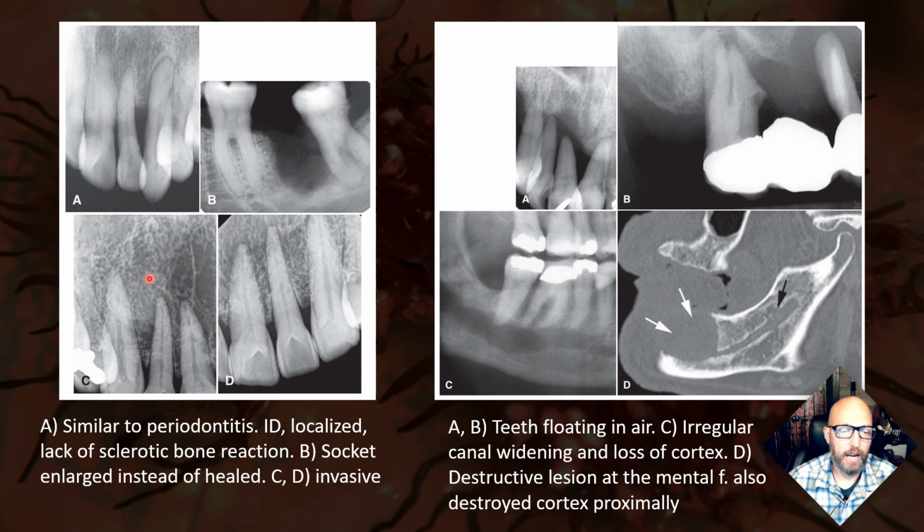It's starting to invade into marrow spaces, and then what's the key sign here around the roots of the teeth? See that little radiolucent haloing? We said malignancies really like to follow that path of least resistance. They extend into the apices or into the PDL spaces of teeth and destroy the lamina dura around it, somewhat of an irregular PDL space widening appearance. But that is a strong indicator of malignancy, even over a potential acute osteomyelitis.